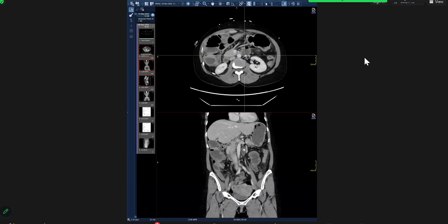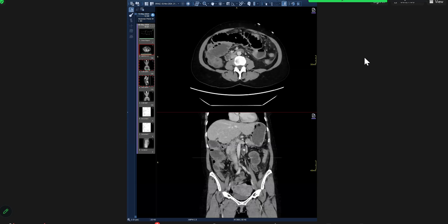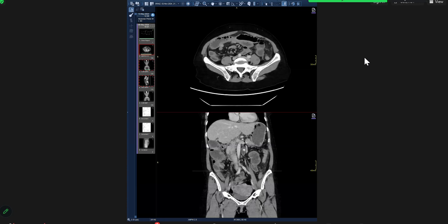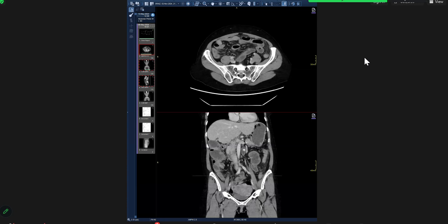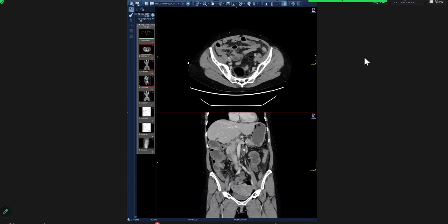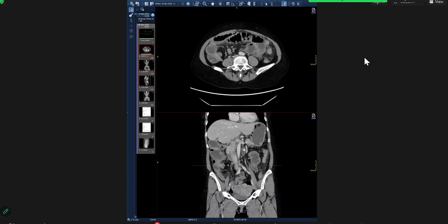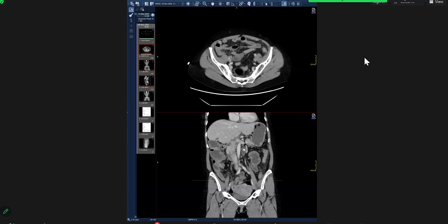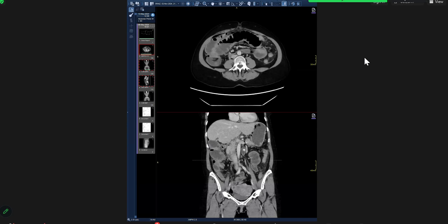Okay. I think I would ignore it. So how can you ignore it? Because it's very proximally present, but the bowel dilatation extends beyond that, isn't it? Yes, ma'am. I cannot see the transition. I cannot make out the transition point. So I just want to give you a description before I say anything. So just describe it and just tell me what you want to do next.